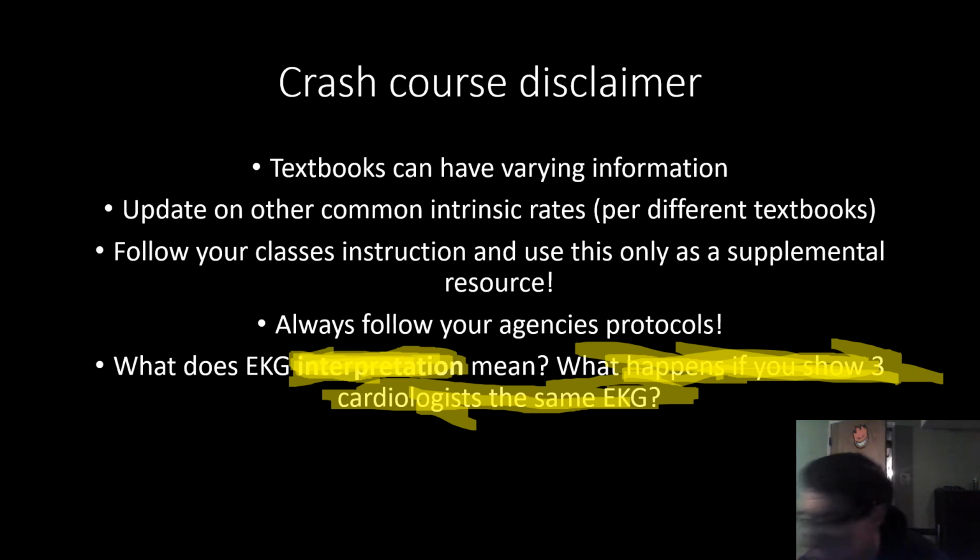So one last thing I wanted to talk about, though, with paced rhythms: those are technically rhythms of their own, because, for instance, with ventricular paced rhythms, there's that wide complex after, that makes it hard to interpret. So a paced rhythm is just a paced rhythm. If you see pacer spikes, automatically you just call it a paced rhythm. So even if you think it looks like a sinus rhythm, if there's a pacer in there, it's just a paced rhythm. So refer to it as such if you see those pacer marks: paced rhythm. Okay, I think that just about does it.